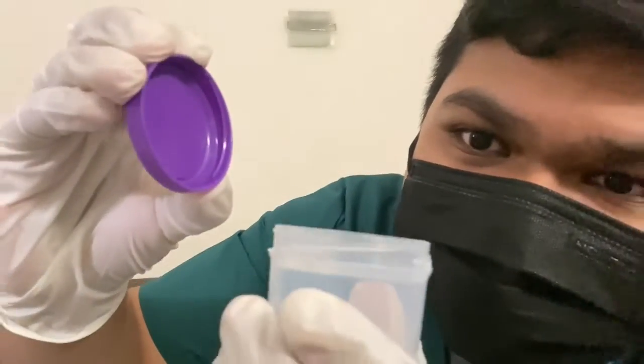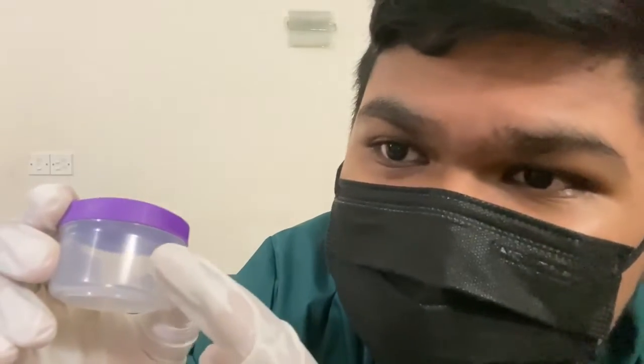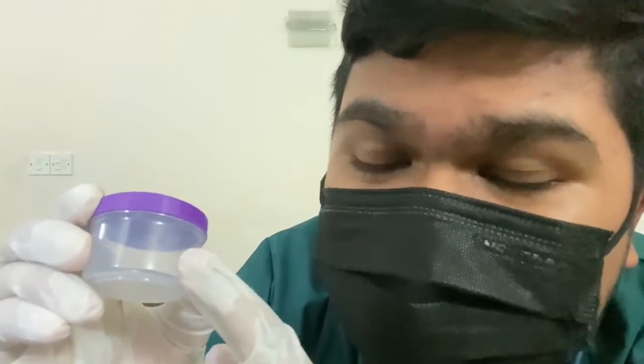Okay, pause. Sorry for interrupting the list of instruments that we would need for the demonstration. But just for clarification purposes, this container is almost identical to a urine specimen container, considering it can uncap itself like this, and it's about the same shape, cylindrical in size. On a normal urine specimen container, it would have written the name of the patient, the date on which the urine was collected, as well as a specific identification card.